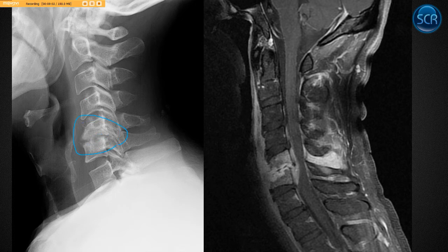Well, if this were a tumor, it would destroy bone more so than the disc, because tumors don't arise from the disc. This is disc-centered. It's going equally across both sides. So this is a disc-centered pathology. So we should be thinking arthritis. No real arthritis attacks the disc other than AS and occasionally RA in the cervical spine because of the uncovertebral joints. But this is infection.